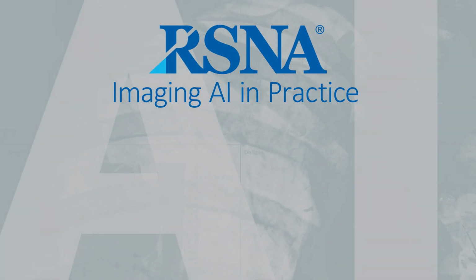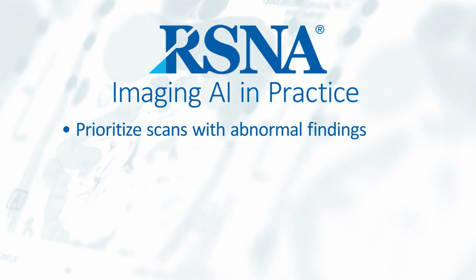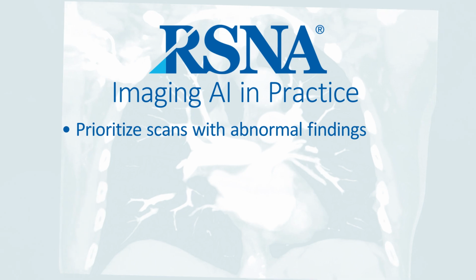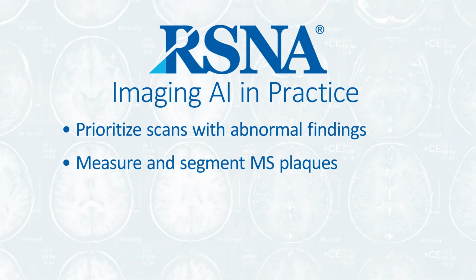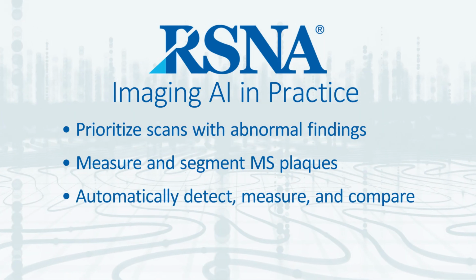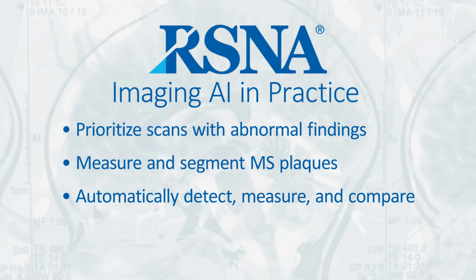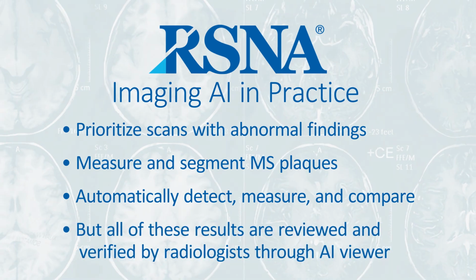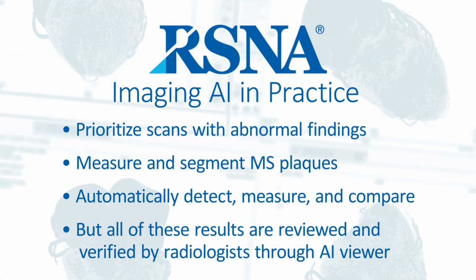Benefits shown in these specific demonstrations include prioritization of scans with abnormal findings, including lung lesions on the chest radiograph or stroke. Measure and segment FLAIR DWI mismatch or multiple sclerosis plaques. Automatically detect, measure, and compare the small lesions such as MS plaque or lung nodules. But all of these results are reviewed and verified by radiologists through AI Viewer.